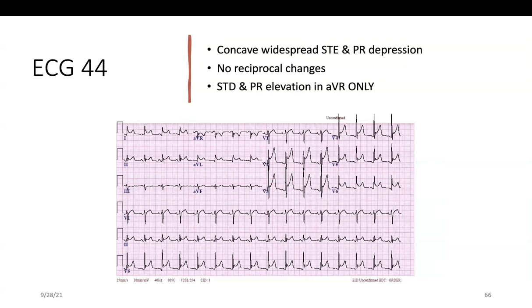يعني if you look at the ECG في V2, V3, it's very prominent الحقيقة. يعني it's significant ST elevation which usually you don't see في pericarditis. But what differentiated here is ما في ST depression في AVL. Okay. ما في reciprocal changes في the other leads. If you see ST depression in AVL, okay, then this is most likely ischemia. The only two leads that could show ST depression is AVR. Okay.